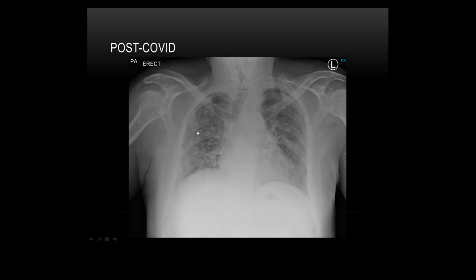So there are going to be some patients whose lungs are really, really bad after the COVID infection. Like I said earlier, prior to actually doing the talk, there are some where the lungs completely clear afterwards, but there are quite a few cases where they become fibrotic. And as I said earlier on, it's being said now that COVID is actually accelerating the ILD that they have. So it's one thing you're really aware of.